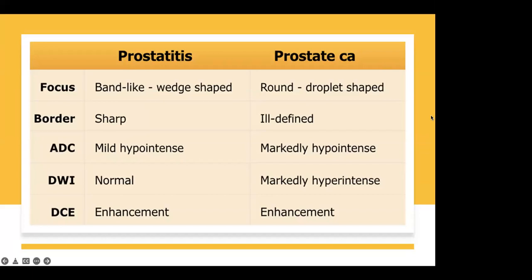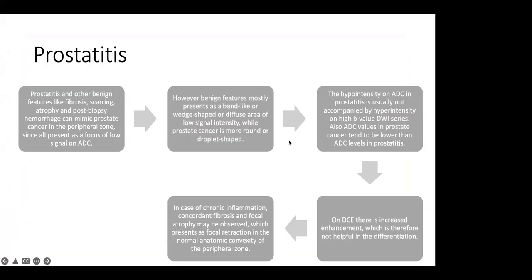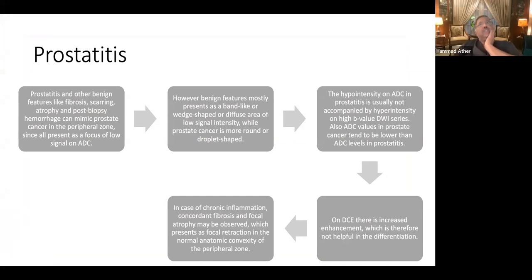For that reason, you cannot distinguish prostatitis changes on contrast enhancement, because BPH changes can also enhance early like the cancer.